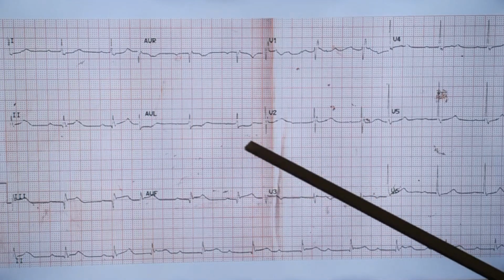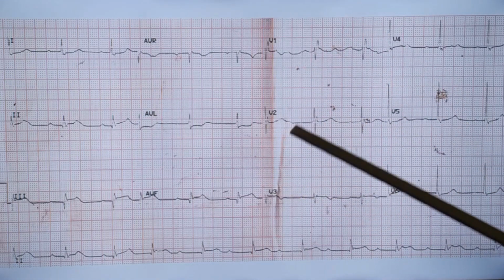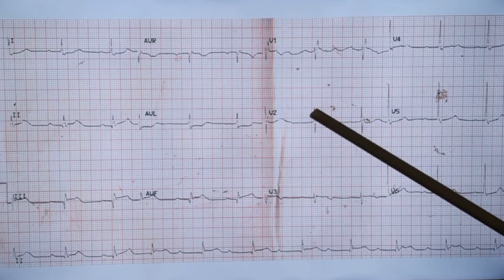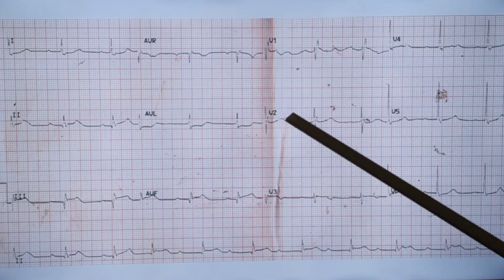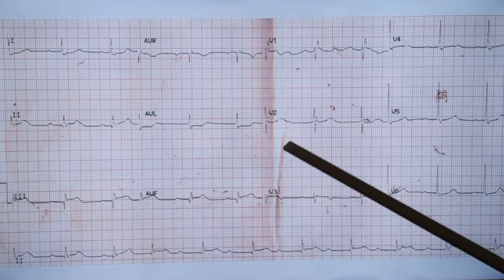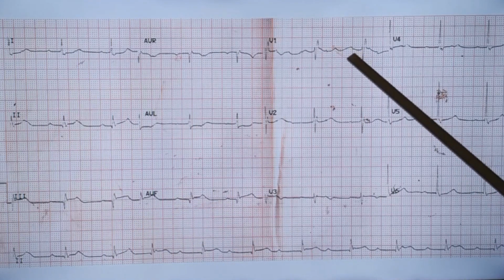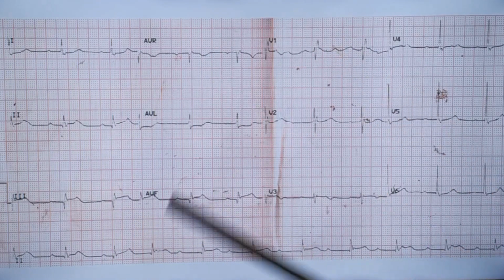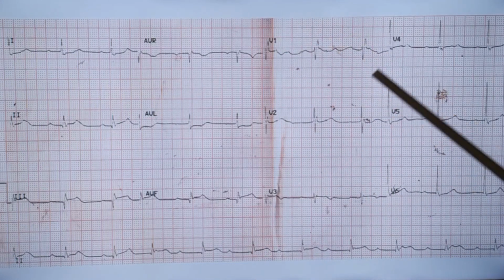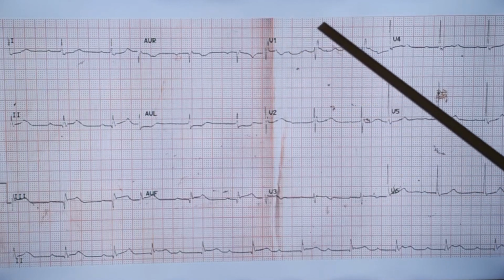So if there is dual blood supply lost, there is a very possibility, typically left anterior descending, because the right bundle will be supplied by the left anterior descending coronary artery. We do not know when a patient presents with acute infarction whether there is pre-existing left anterior descending disease which was earlier there, and this could be the acute occlusion. This territory would have been supplied by collaterals from right coronary, and when right coronary gets occluded, there will be ischemia in this territory also, and ischemia of the right bundle can cause right bundle branch block pattern.